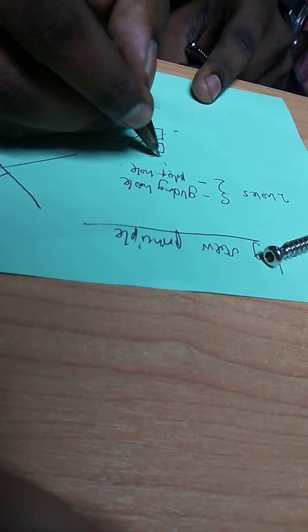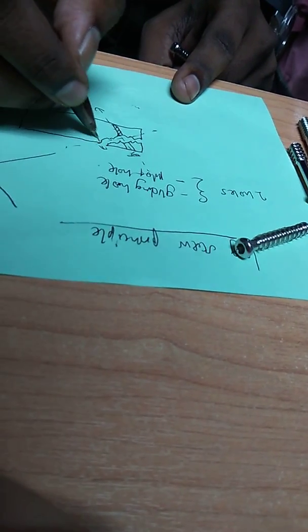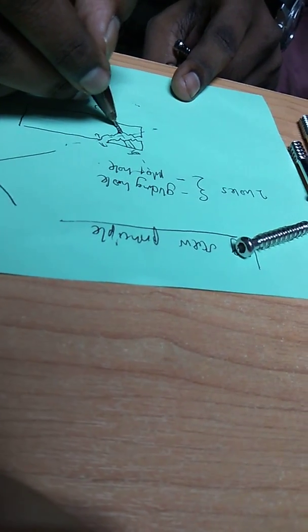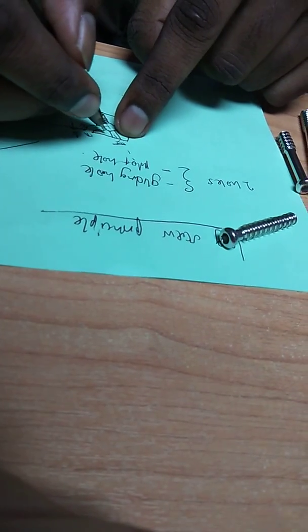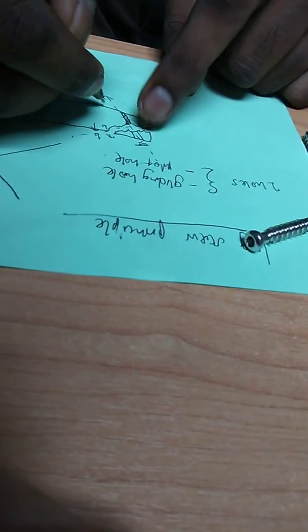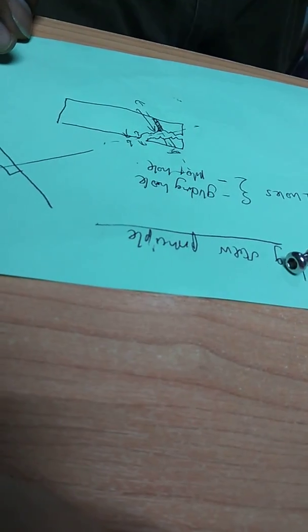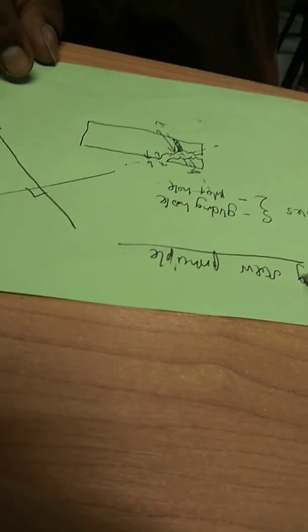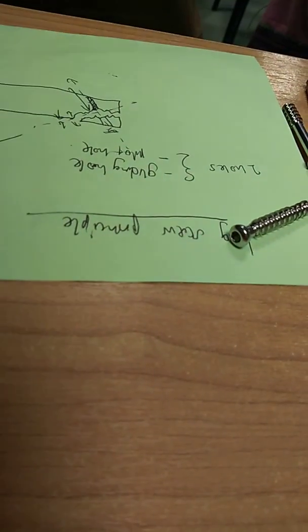When the screw is being placed initially, as you are driving the screw in, these two fragments will distract. Okay, but as the screw engages at the thread here, then it will compress. It will compress more and more, because this part will just glide down. This part, once it catches the threads here, will create a force up, compressing. So that is the lag screw principle. Understand? Understand or not? If you don't understand, I can explain again.